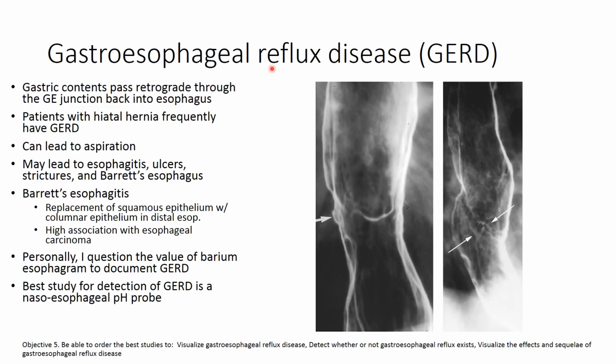Now, it's also true that we can see active reflux on our barium swallows, where we watch barium go back from the stomach into the esophagus, and we report those on our reports, but I'm not really certain how valuable that observation is, just because barium, again, is kind of a noxious substance.